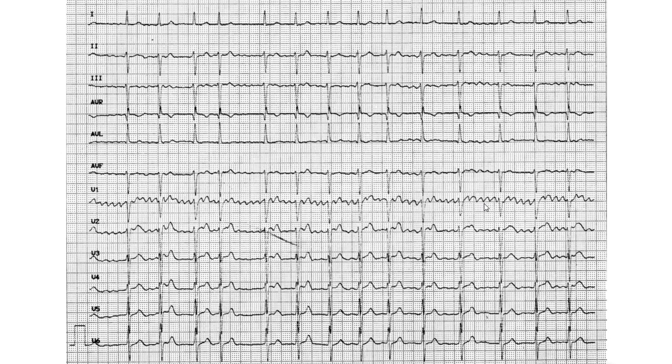However, it is quite debatable. You might even be able to get away with the idea that this is like fibuloflutter or something like that, because it's not necessarily fibrillation, not necessarily flutter, it's somewhere in between. You can't really say. If you use 4 as the FF peak distance, you'll actually get 375, which is fibrilloflutter. So if you're able to present your logic, really, they're not robots, so they won't mind, so long as it's between flutter and fibrillation.